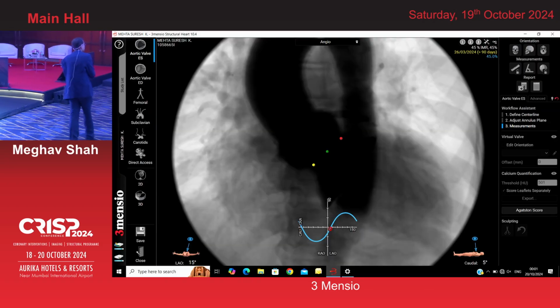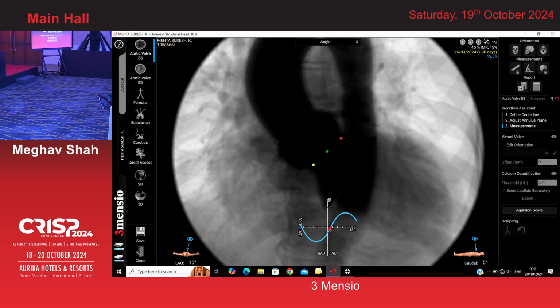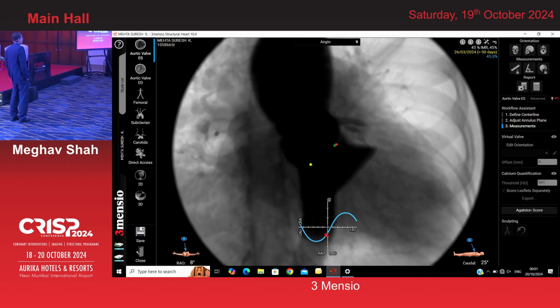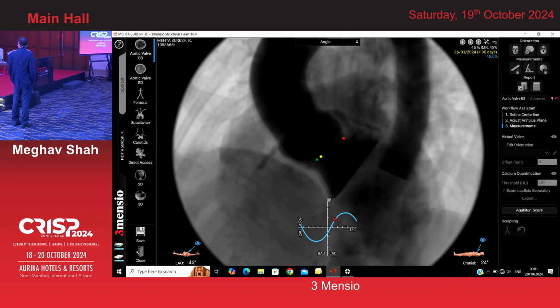Yeah. So the next part is where I will be talking about only S-curves, because all the things that I have shown can be shown in other softwares also. This is a paid software.